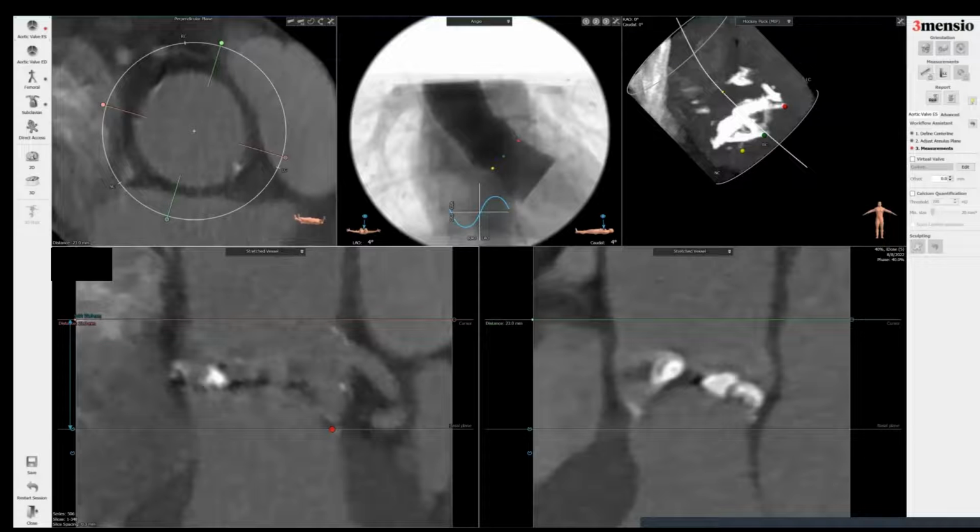So I make a right click here. It's called a sinus valsalva height. So that's my default valve sinus valsalva. That's the tallest height. And then this is the level cut point of the left main. So I go to a ruler with a ×2, and then I'm going to go a short and long axis of the sinotubular junction. I'm going to label that as an STJ.